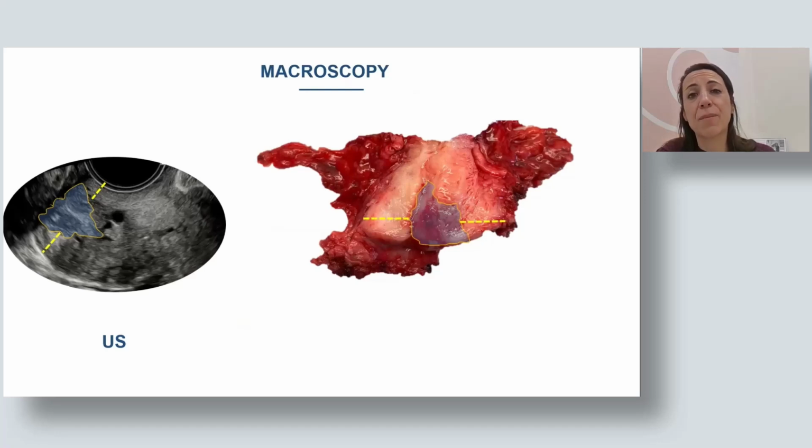I would just like to summarize that we can use ultrasound examination to assess patients with cervical cancer. We can also stage the disease. We can follow up this lady with ultrasound examination. We can take the biopsy during the examination. And finally, we want to explore also the role of artificial intelligence and radiomics to improve the diagnosis and management of these patients.